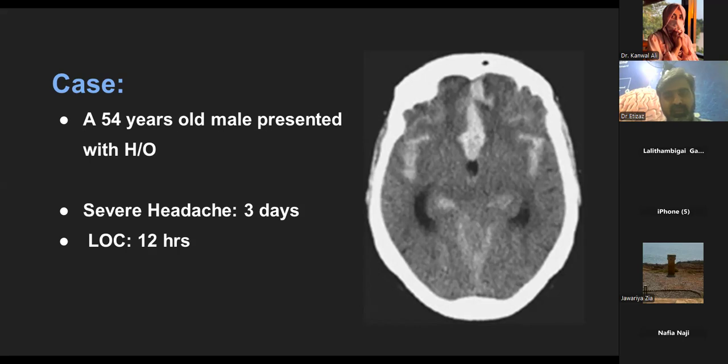So my provisional diagnosis, should I give a provisional diagnosis or just interpret it? These should be definitive. Okay, so my diagnosis is a subarachnoid hemorrhage secondary to a probably ruptured aneurysm. Most likely, this is from the anterior circulation. It could be a ruptured ACOM aneurysm, most commonly.